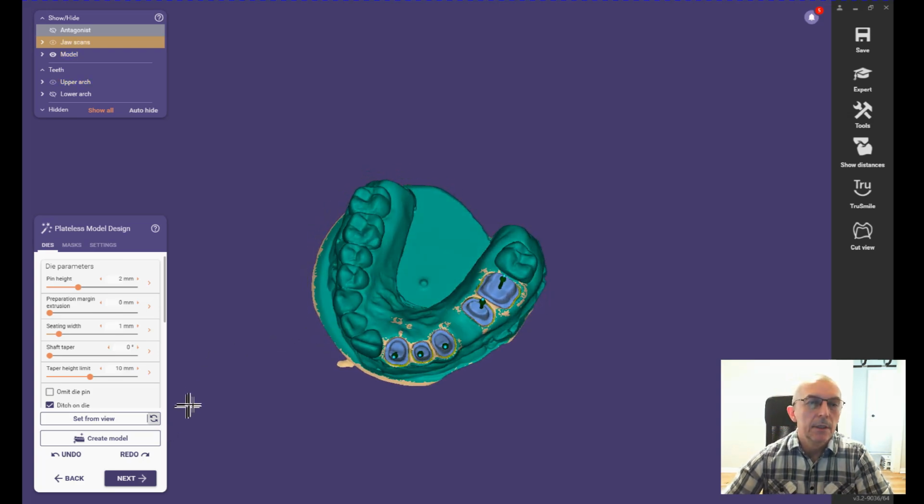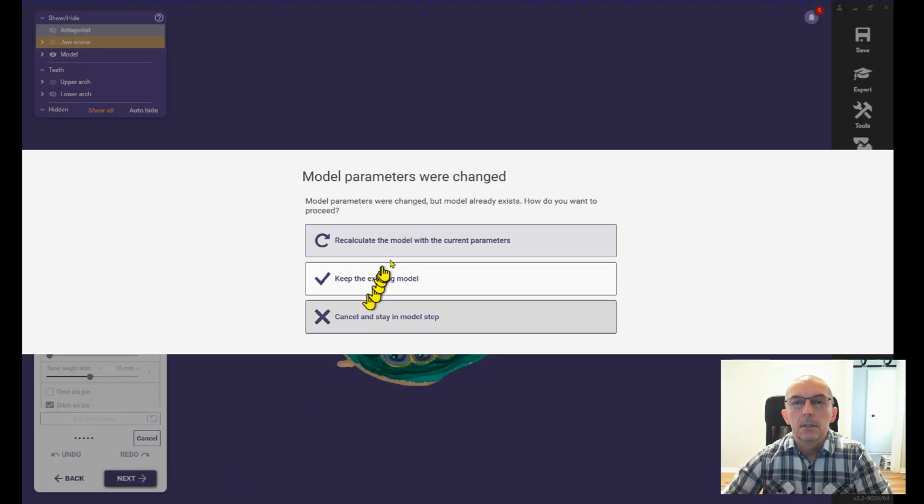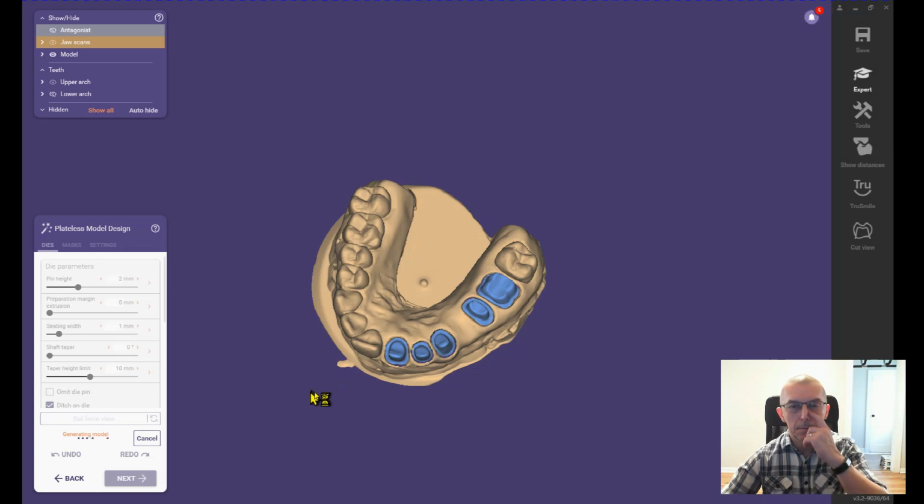So let's do it again. Recalculate. It always gives you choices. So let's recalculate everything, and let's see how it changed it.